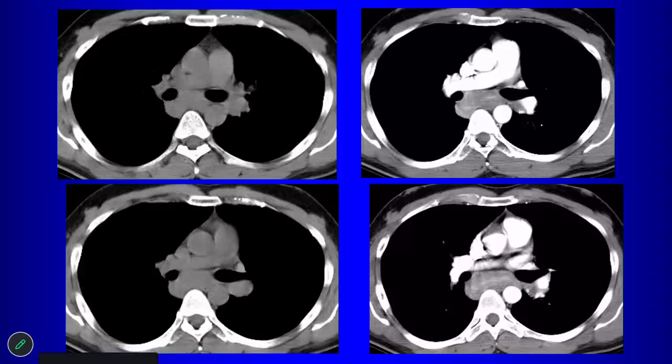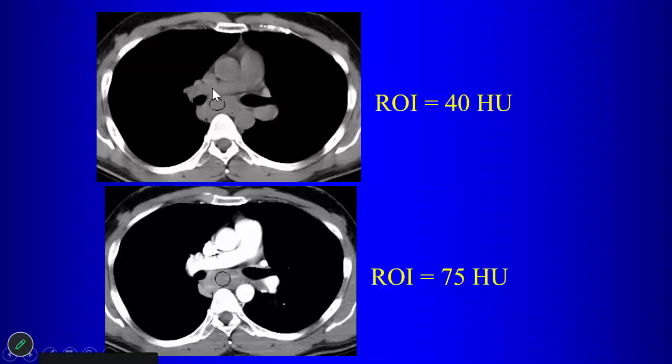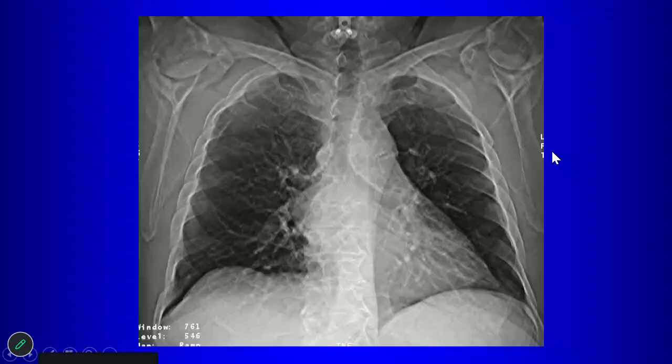This looks like, if it is from the esophagus, it's growing away from the esophagus. And what kind of tumors do that? So that would be a GIST tumor of the esophagus. But this was enhancing. This turned out to be lymphadenopathy.